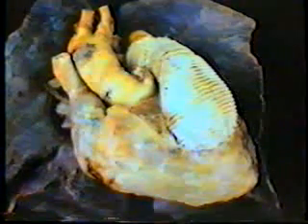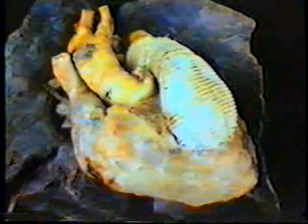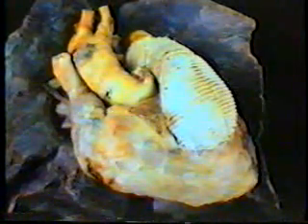Now we will discuss evaluation of valvular conduits. Extracardiac valve conduits from right ventricle to pulmonary artery are frequently utilized for correction of various forms of cyanotic lesions with complex right ventricular outflow tract obstruction. Retrosternal position and highly refractile nature of the prosthetic material make the 2D echo examination extremely challenging. Hence, not infrequently, conduit visualization may be suboptimal.